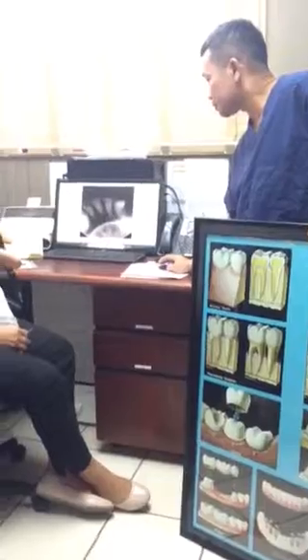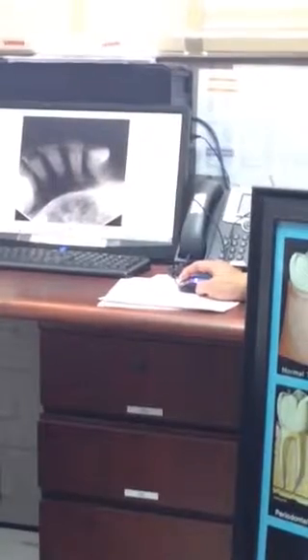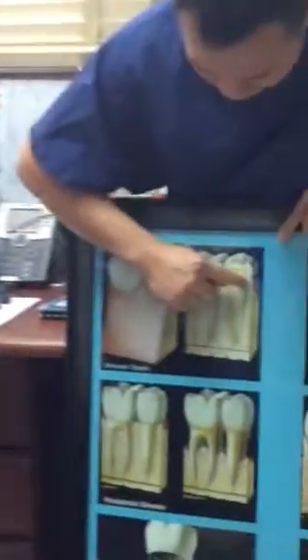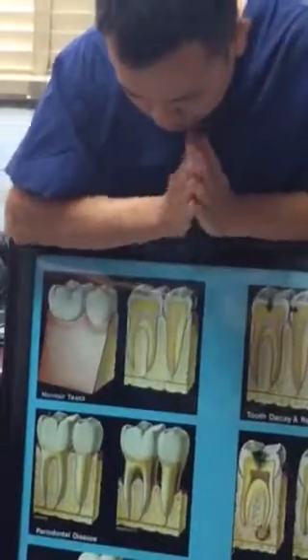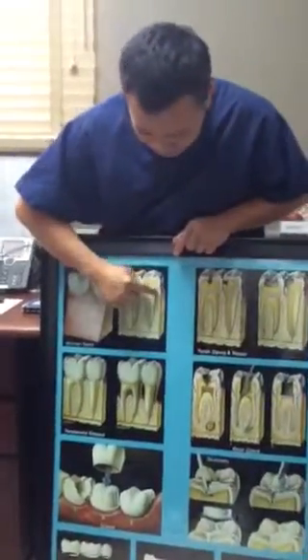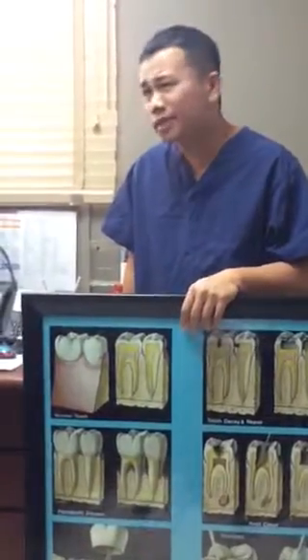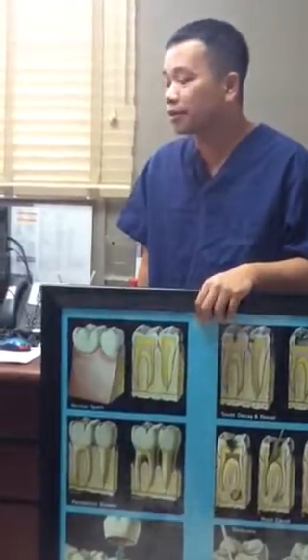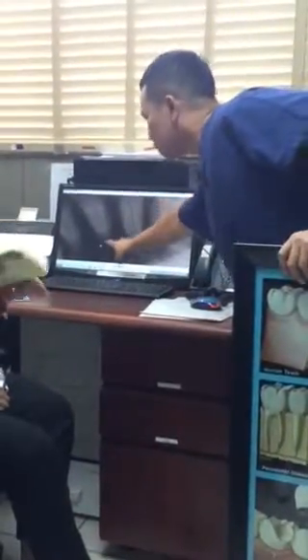This is not an abscess. Okay. Let me tell you why this is not an abscess. Our tooth has millions of ligaments holding it into the bone. It's not a solid connection from bone to tooth. There's millions of ligaments around there. That ligament space, we call it, what the heck would we call it? Periodontal space, right? It's been so long since I've done perio, I don't remember. It's the periodontal ligament space. Patients don't have to know that. But that's normal all the way around there.